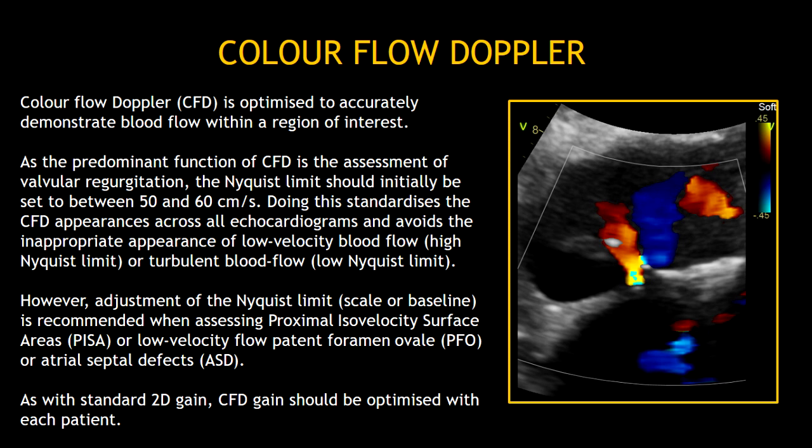However, adjustment of the Nyquist limit is recommended when assessing PISA, PFO, or ASDs. As with the standard 2D gain, color flow Doppler gain should be optimized with each patient.